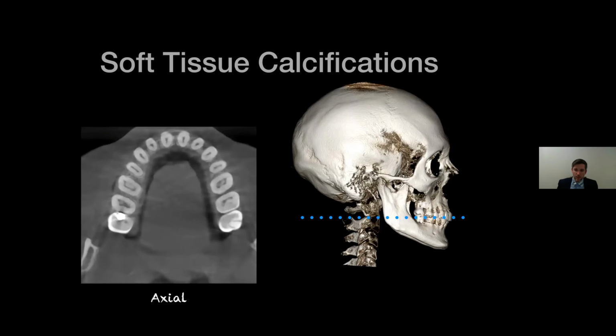With finding root fractures, it's all about the diagnostic task. With finding root fractures, you would want to use a little bit higher dose. But for an orthodontist, you're just looking for where the root is in the alveolar housing. So you don't need the 75 micron voxel size for that.